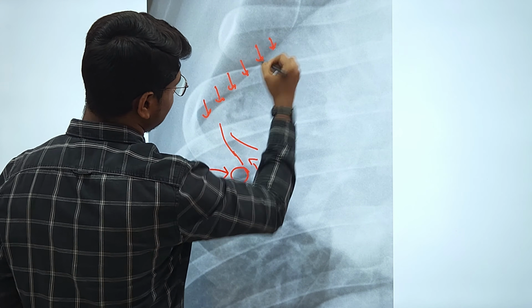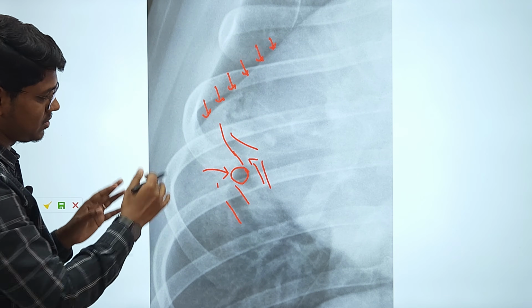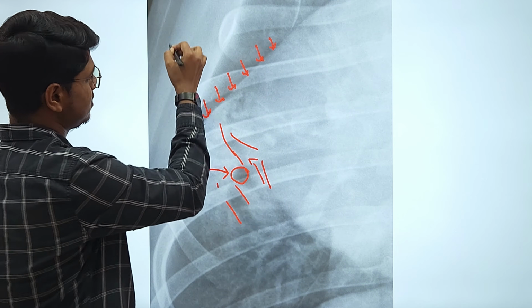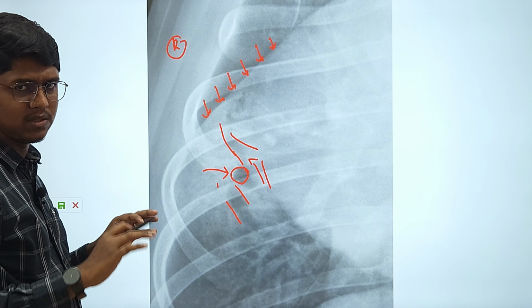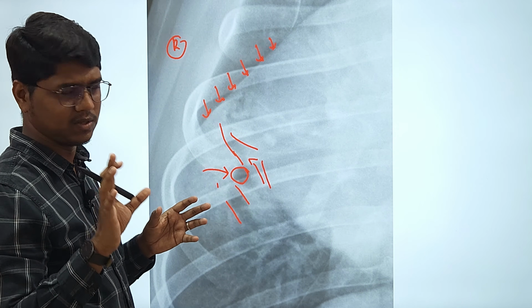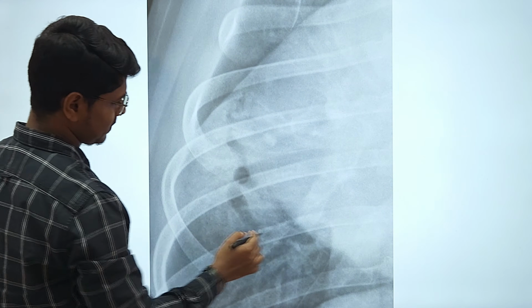In case of pleural effusion, you will find lung retraction along with the lobar sign. Here there is no lung retraction, and you can also see the opacity of this particular lung lobe. You have the middle lung lobe, this one on the right hand side. It is the middle lung lobe which has been infected with pneumonia or pulmonary edema. Pulmonary edema usually happens in the dorsocaudal lobes, so this one is the middle lung lobe, most probably pneumonia.